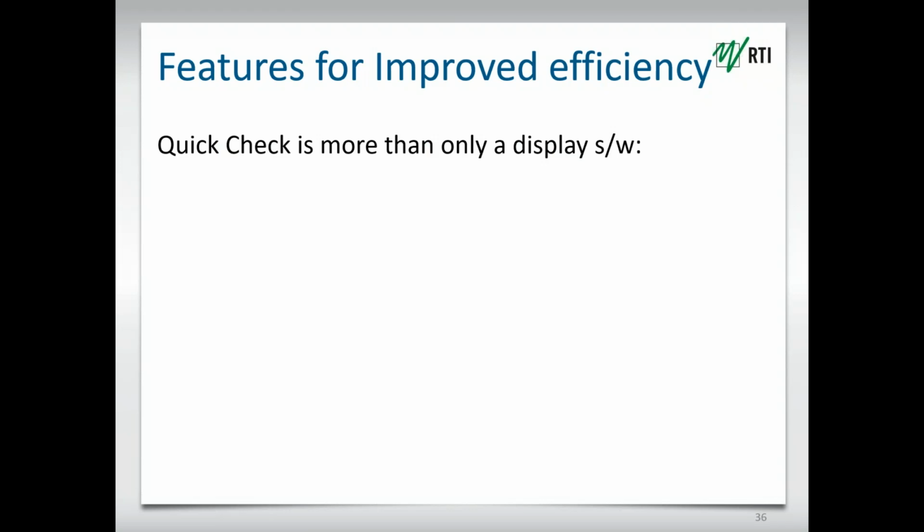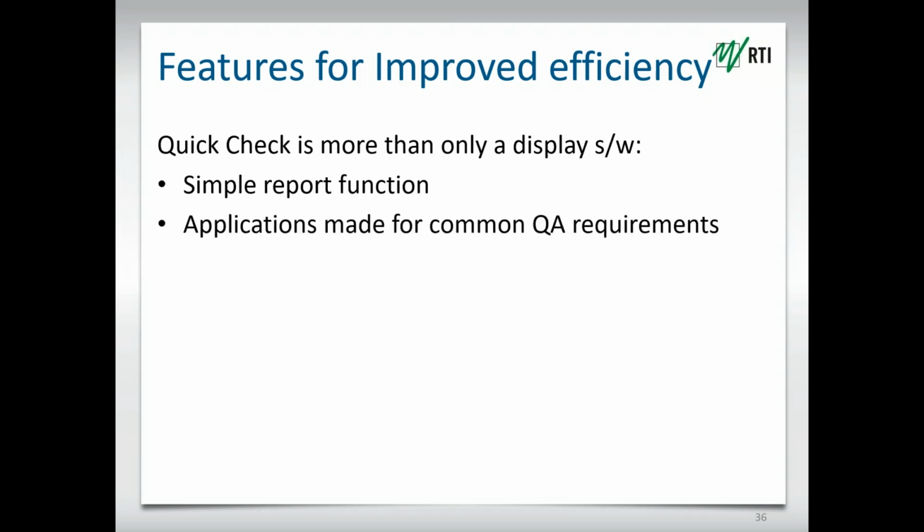So this is then also quick check, the basics of it, but we've tried to add that a little more. It's not simply a display software. We've added yet some other stuff. A simple report function to be able to report and show the results of your efforts during the testing. Applications have been compiled, and what they are, we'll see them, but they're made for common QA requirements in the respective modalities.